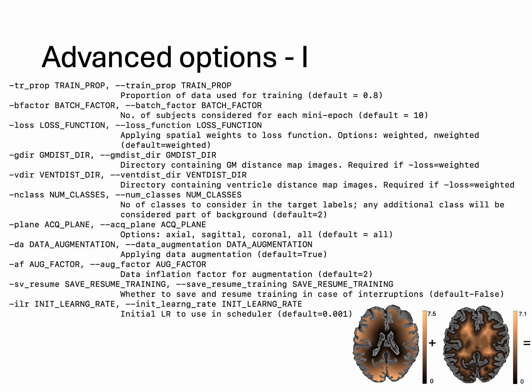Data augmentation, so what is the factor you want to augment with, and save and resume training. Okay, so we want to keep this flag always, it would be good to have it true. The default option is false, because whenever you switch it on, it's going to save the whole model, which will take some memory.